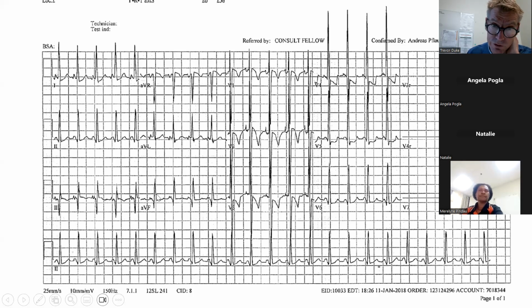So it's in a positive direction. And in aVF, you've got some up and some down. So you've got 5, 10, maybe 15 up and about 5 down or 4 down. So that net deflection, therefore, is, say, 9 in the positive direction. So you've got a positive deflection of 20 and a positive deflection of 9.